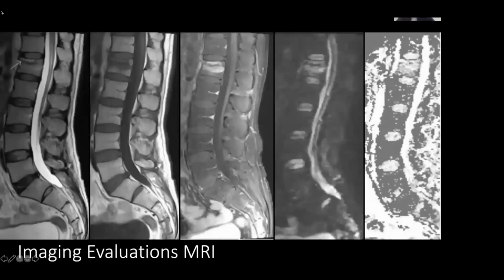On sagittal section, again, you can see the fracture, not really much of a diagnostic dilemma, but you can see the edema on the STIR, which is, as I said, a type of T2. You can see that the marrow is dark on the T1. And then we have these diffusion sequences, which in this case actually allow us to see that this is a benign fracture if we weren't sure.